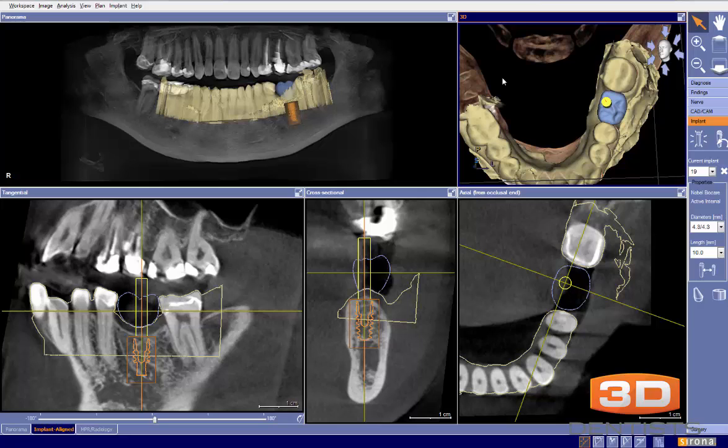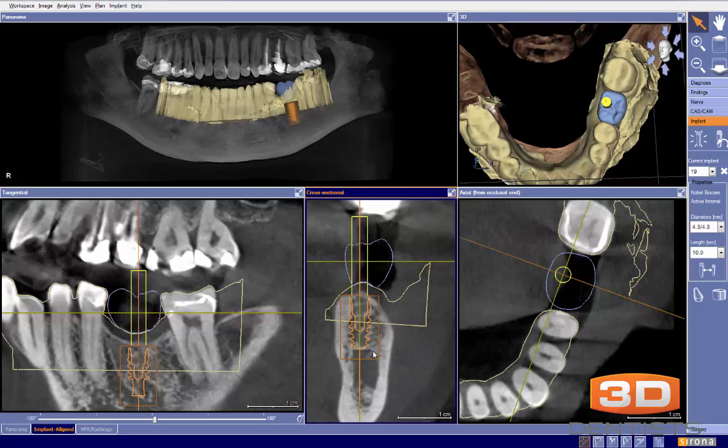So again, with a surgical guide, since we're able to properly bring in the CEREC data, our options are OptiGuide, DigiGuide, CEREC Guide. I would say that this is a great case for any of those guides, OptiGuide, DigiGuide, or CEREC Guide 2. So let's go ahead and begin and take a look at our overall game plan.